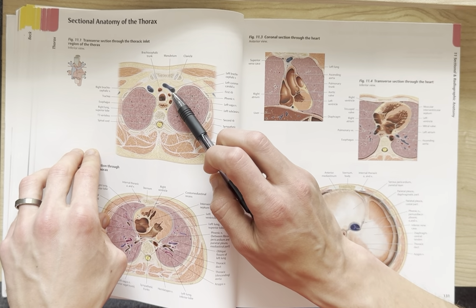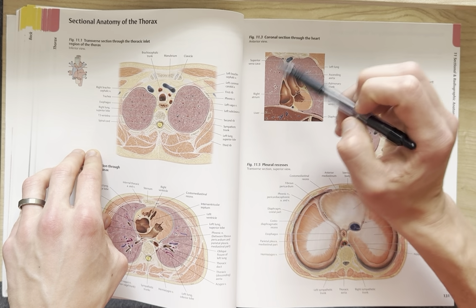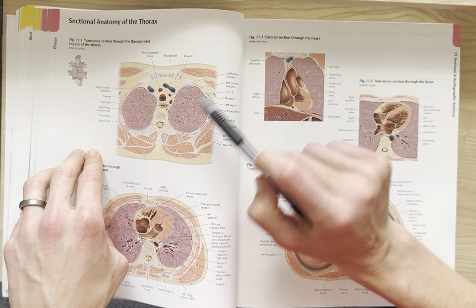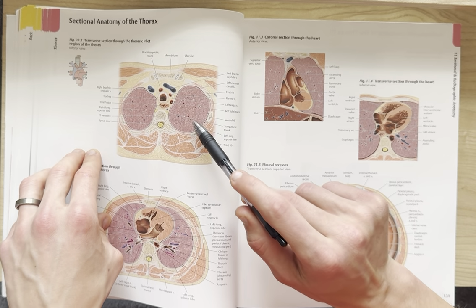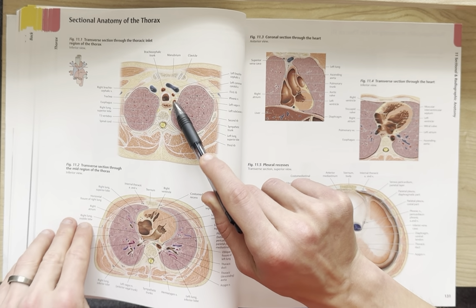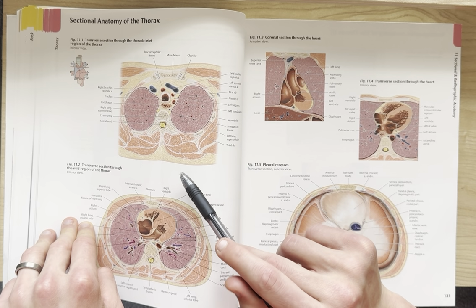And here's your left brachiocephalic vein, your left common carotid artery, and then, as you might remember from some of the previous videos, there's that first rib, which tells us where those features are going to be. Here's the phrenic nerve running down to your diaphragm. Here's your left vagus nerve running almost concurrently with it. The left subclavian artery. Here's the second rib.